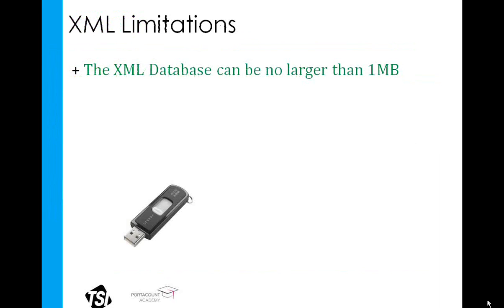Now, as I said before, the flash drive is really designed to be a temporary storage solution. We should always be bringing that data back into the FitPro software via the import function we discussed earlier. Now, in addition to this, it's important to note that the flash drive database does have a limitation on memory capacity.